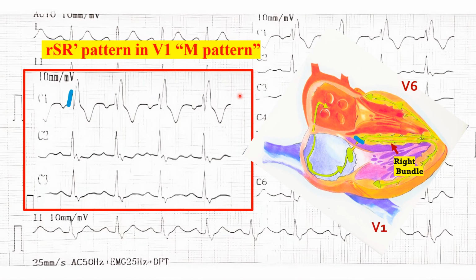First of all, we can see with this color coding that the initial septum is normally depolarized. So this conduction, when it goes down the AV node, goes towards chest lead V1, and that's why we see the positive deflection.